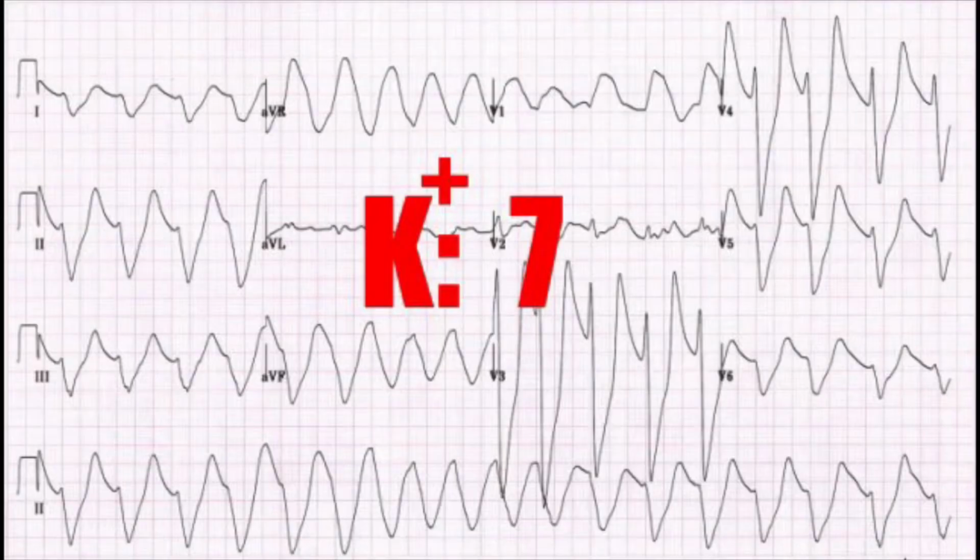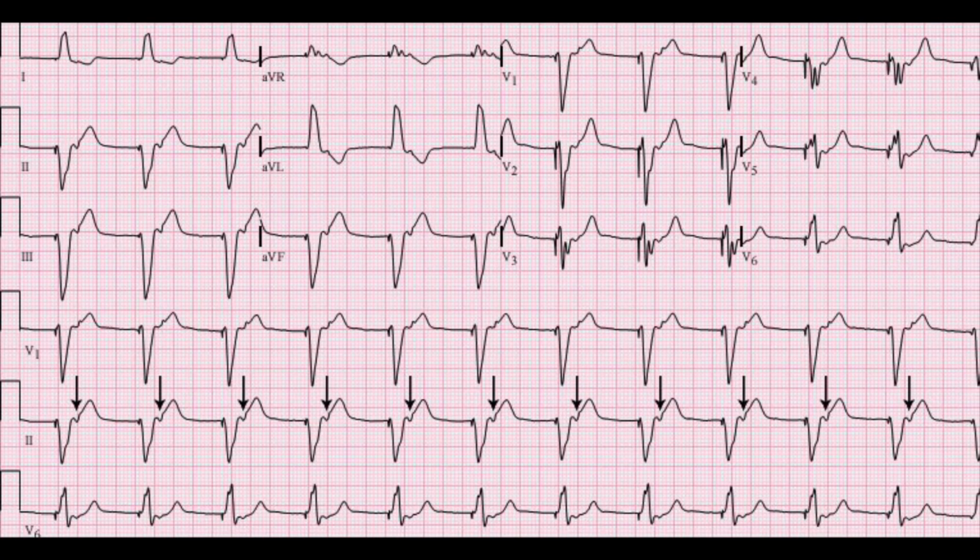Metabolic derangements like hyperkalemia could also widen your QRS complexes and kill your patients. And I'm sure you're familiar with the pacemaker spikes and the wide QRS complexes that follow them. With the advance of pacemaker technology, the spikes have become more subtle each day, and finding them has become a headache. That said, some pacemakers work only on demand. They kick in only when required.